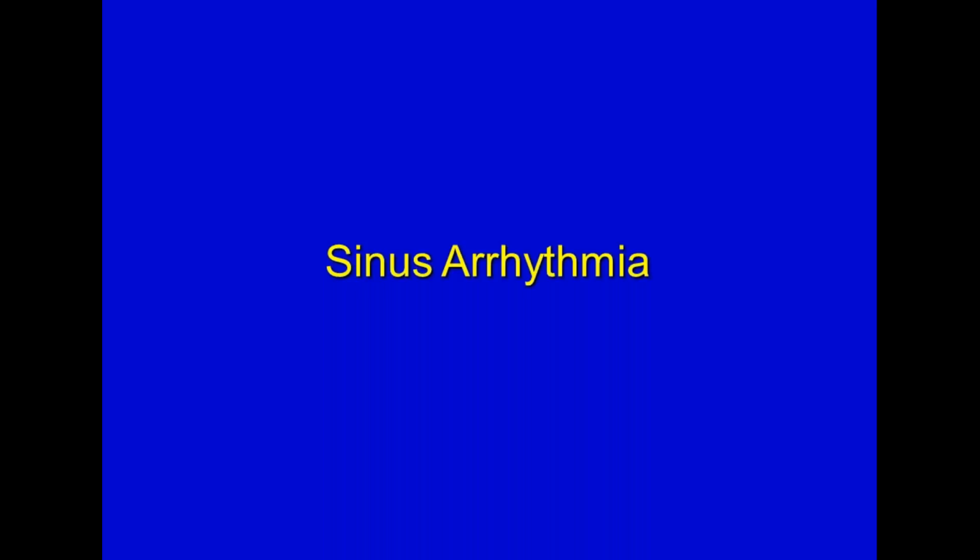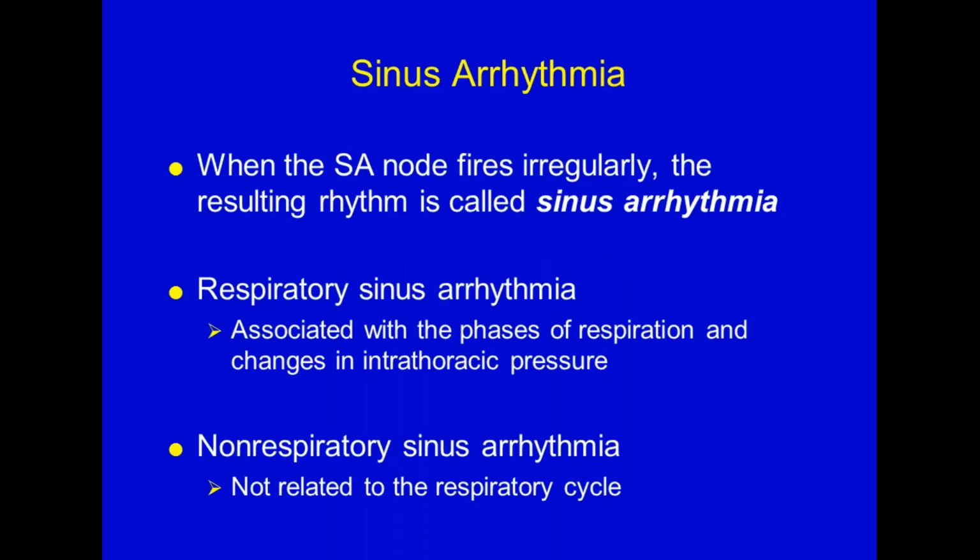So, sinus arrhythmia. Big deep breath, because now we're going to change the game a little bit. Okay, so the SA node fires irregularly. The resulting rhythm is a sinus arrhythmia. It can be a respiratory sinus arrhythmia or a non-respiratory sinus arrhythmia.